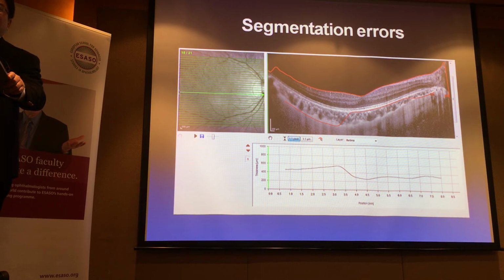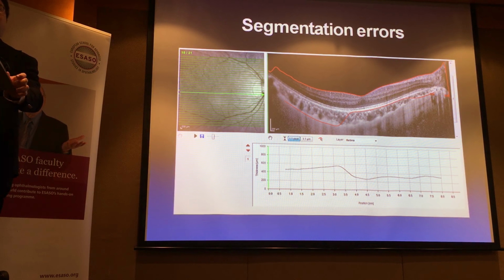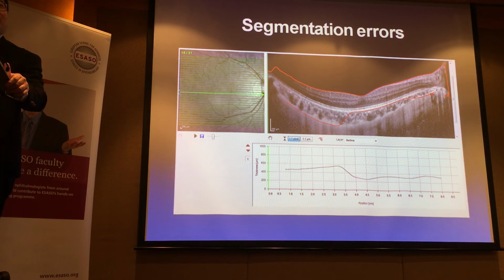To posture the head. Yeah, it depends how big your gas fill is, but if it's right at the midpoint, then it's going to be a problem, right? But if it's a half fill, you might need to adjust it a little bit. Ideally, you want a fairly consistent view, either no gas or gas there. But if it's right at the boundary, then obviously you're going to have difficulties where it crosses from gas to fluid.